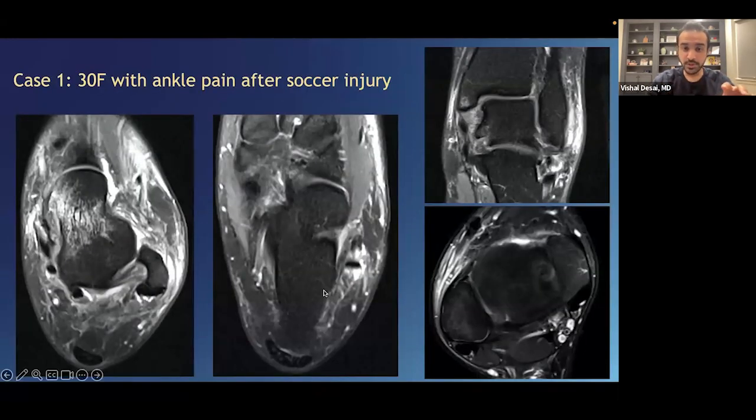For all of these, I'm going to show the PowerPoint slide first, then we'll move on to the poll question, because I can have the images blown up there. Since we don't have the luxury of scrolling through these images, I will help you by highlighting the areas of interest to clue you into the answer.